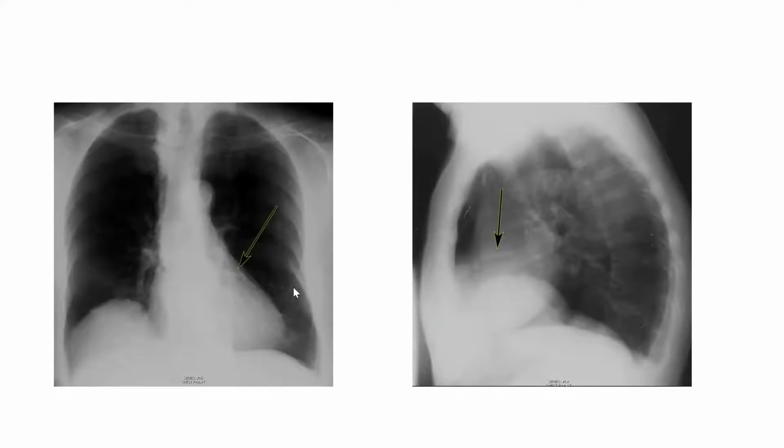It's pointing to the aortic valve, yeah, Hatim. But if you focus more, you see this is a kind of linear radio-opaque density, and the location does not actually belong to the aortic valve, because you see it's going towards the left border of the heart. So this is coronary calcification. So you can see coronary calcification by chest X-ray. You can sometimes see the stents. Yes. Okay. So this is coronary calcification.